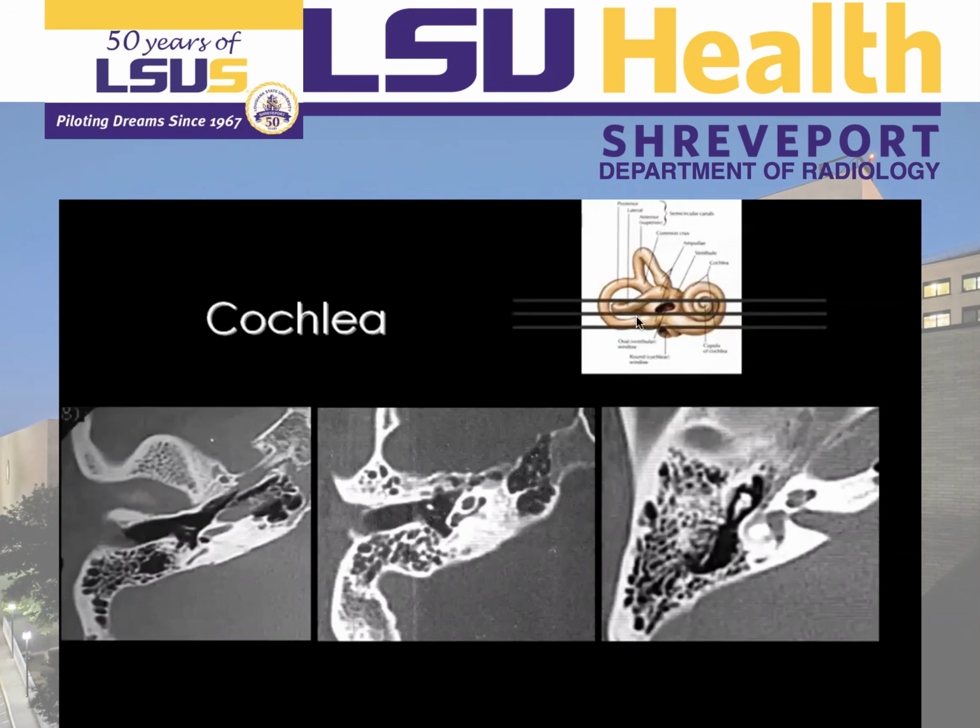If you go to this lower portion of the cochlea here, this is the basal turn of the cochlea, and it ends in this dot of air that is called the round window. We can see that here, this is the basal turn of the cochlea ending in this dot of air that is the round window.